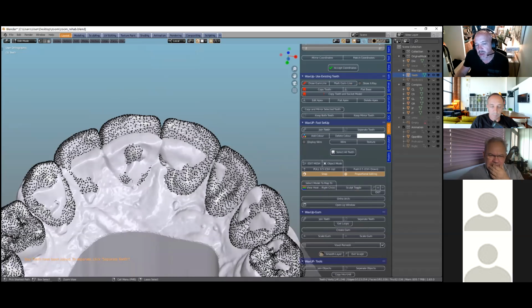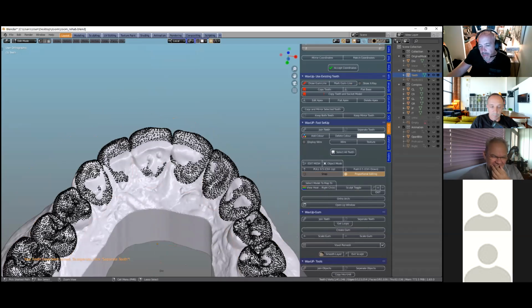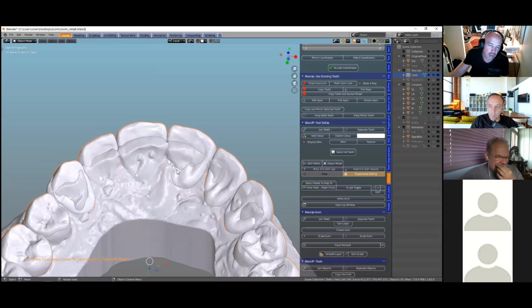It's not so important in this example, but when we're doing crowns and bridges, you may have an occlusal surface hitting the tooth preparation, for example. So we want to bring it out, say 0.5, because we could mill at 0.5 millimeters. That'll lift it up by 0.5, or we can push it down by 0.5.